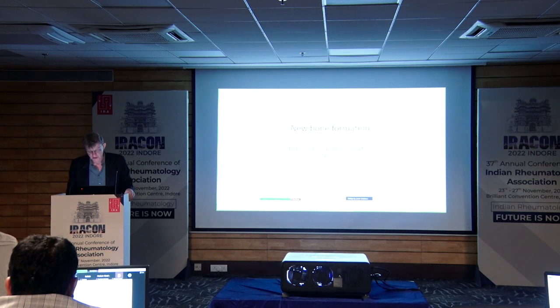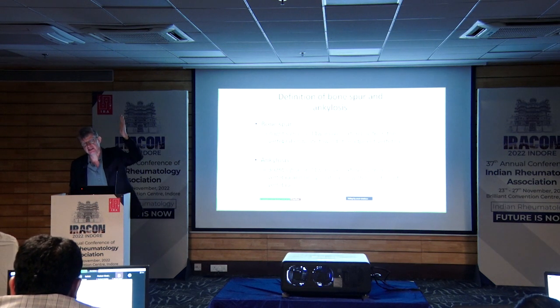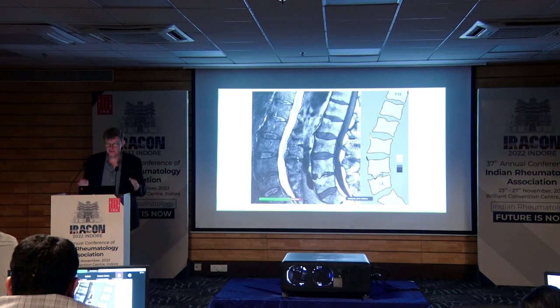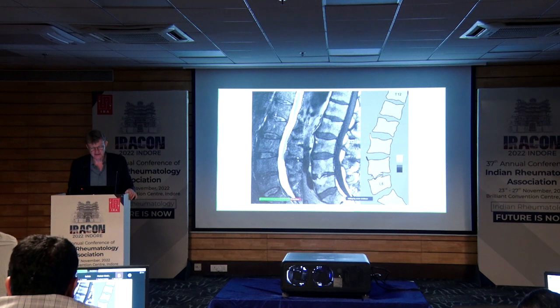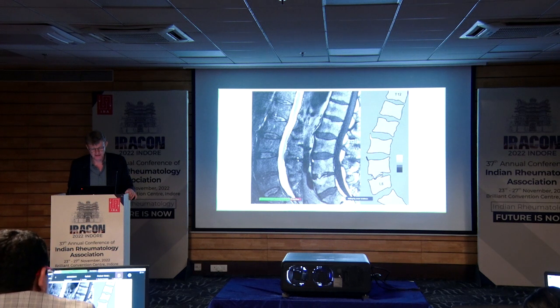Last thing before we move on is the new bone formation. And that is, you could say, the syndesmophytes we know, those pointing towards the next vertebral body. And the way you can see that on MRI is just like in the sacral joints, a bright signal that goes in the direction of the next vertebra. The challenge is that this is not the strength of MRI for syndesmophytes, because you need to wait until they're so large that you can see the bright signal inside them. When they're small and only like this, then they're difficult to recognize.